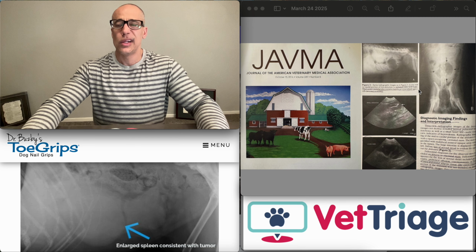This is the lateral plane abdominal radiograph of a dog. The head would be over here, tail over here, and you can see the arrows are showing this gas-filled mass in the ventral caudal portion of the abdomen. Here's the ventral dorsal view, same dog, head would be up here, tail down here. Presumably this would be right and left, and then there's the same gas opacity here. They found mild discomfort on abdominal palpation and a mass on palpation of the abdomen.